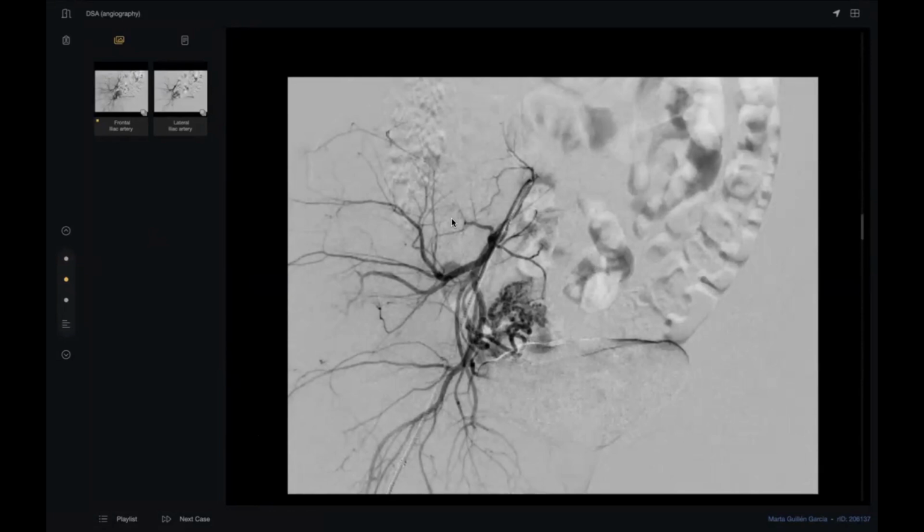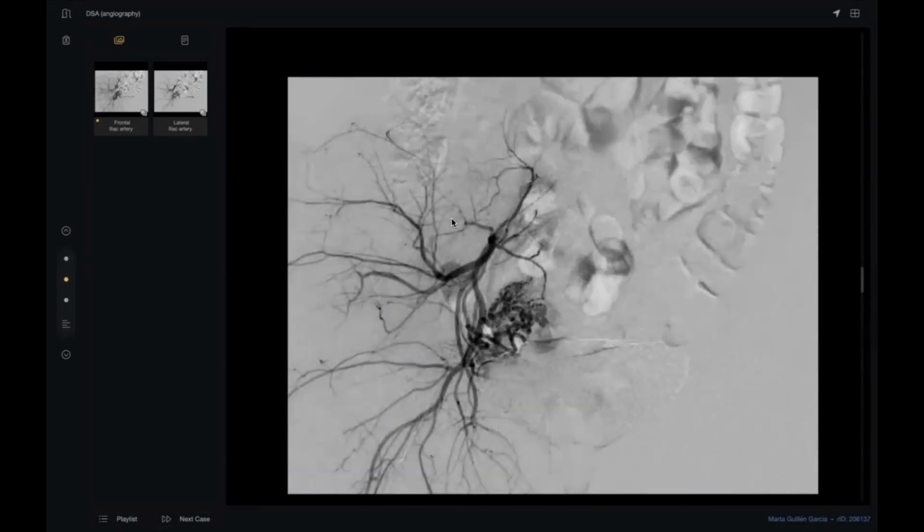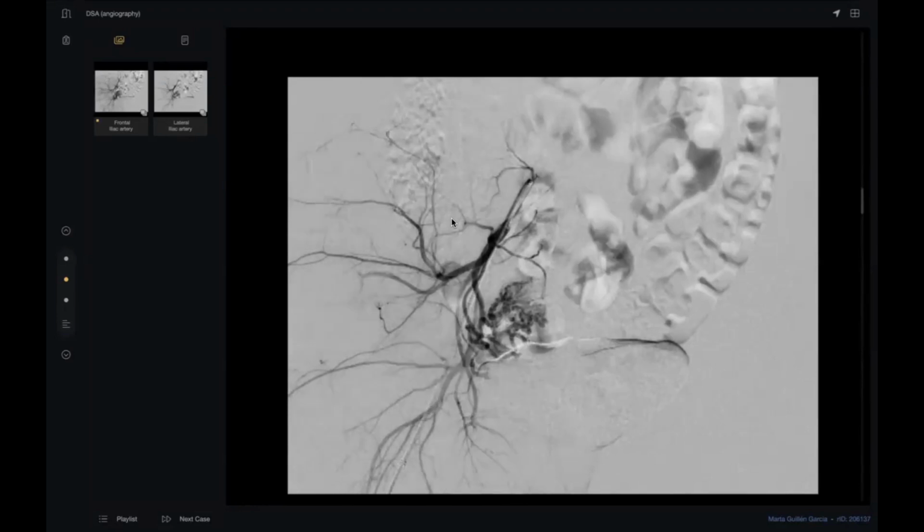This patient just has AVF. The patient had an abortion, so they must have used some instrument. Correct? Yes, traumatic AVF. So next we can refer to an interventional radiologist for embolization. Excellent. Thank you, doctor, so much.